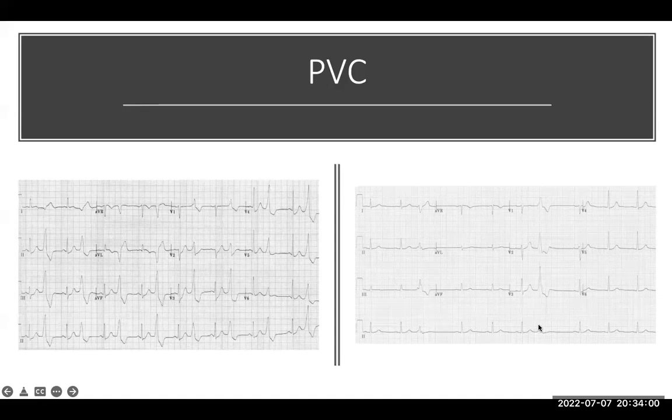So you usually name according to how many QRS complexes are there, including the PVC itself. If there are two normal QRS followed by a PVC, that's trigeminy. If there are 3 QRSs, then a PVC, that's quadrigeminy. If there are 2 PVCs following each other, that's called a couplet, and so on and so forth.